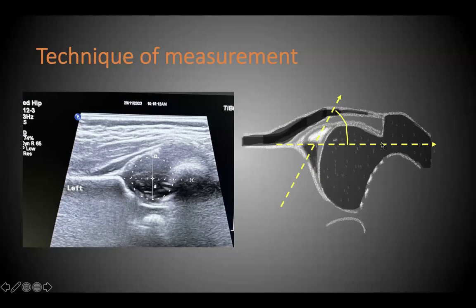degrees, although there is a lot of variation in the amount of the beta angle. And if you draw all three lines together, you would notice that your three lines seldom meet at one point. So if the radiologist is giving you a report wherein all three lines are drawn from a single point, then they probably are not correctly measuring the alpha and beta angles.